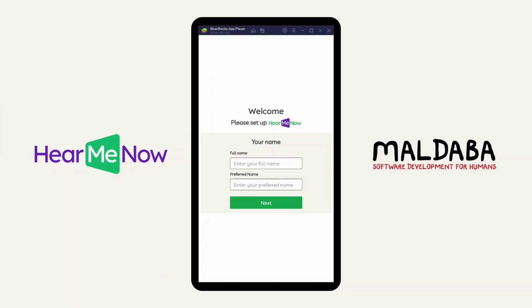You'll now be asked to add your full name, and if you have a preferred name, you can also add this too. I'll put in Fred James and Freddie, and then select the next button to continue.